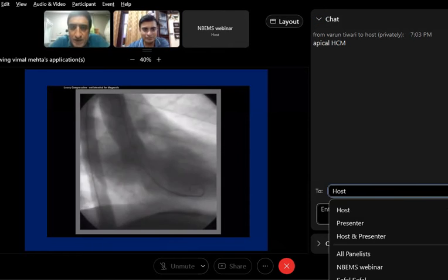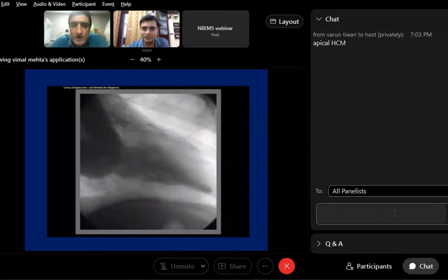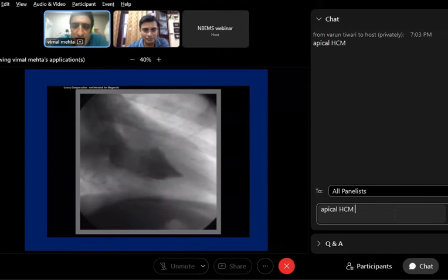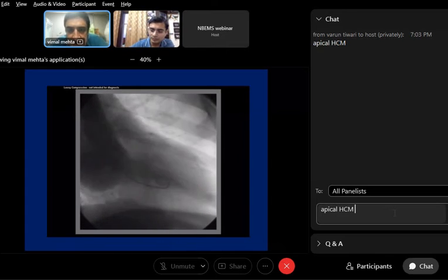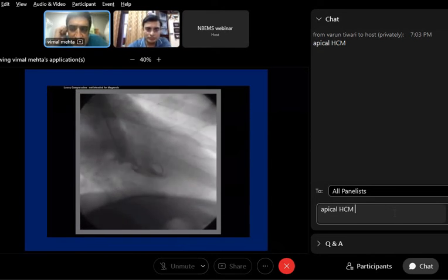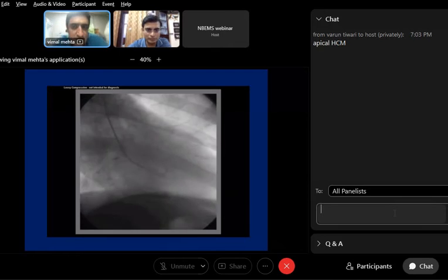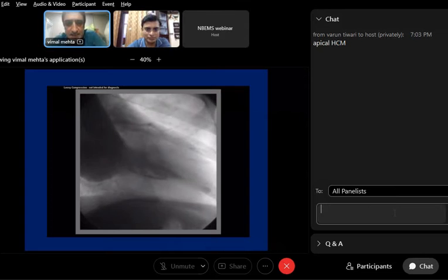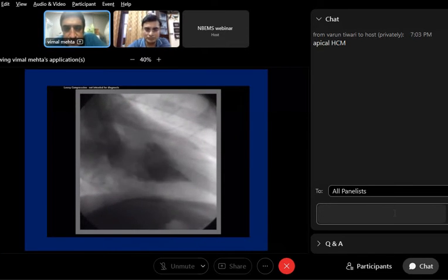Severe MR. Okay, very good. Why do you call it severe? Why do you call MR severe? And if I remove this catheter, do you think this is complete obliteration of the mid cavity? So what phenomenon is happening? Grade 3 MR. Okay, it's a severe MR. We'll talk about grading a little while later.